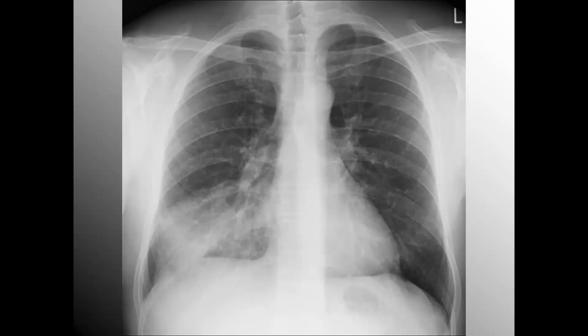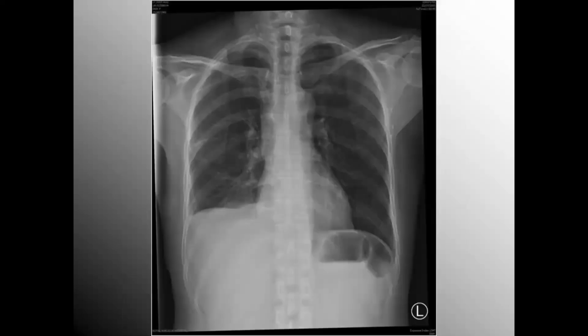So when it comes to pneumonia, it can be described as just an infiltrate, or they may actually put suspicion of pneumonia. You know immediately what's happening here if you're practicing as we go along. I do like to use this chest x-ray, though, for now as a very clear delineation of the T1, very prominent and the widest transverse process of all vertebral bodies of the thorax. So that lets me know I'm at T1.